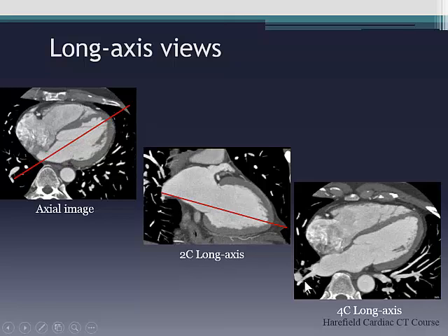So in other words, if you then line up here and line up here, you will get a true left ventricular short axis. So one of the principles that we always try, for those of you from an MRI background, you know you often need two orthogonal planes to help you plan your planes correctly.